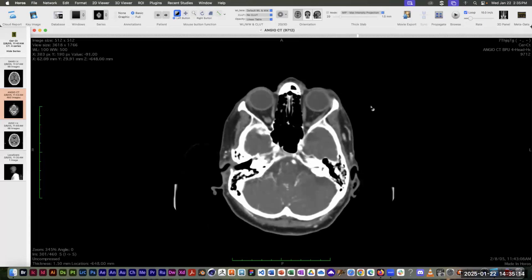All right. So anyway, you can scroll through and have fun looking at the individual slices. But the really interesting part of Horos is the ability to take those individual slices and stack them up to create a 3D model. There are two basic kinds of 3D models that we can create in here, and your exercise today is going to have you create one of each. We're going to create what's called a surface model, and then a volume model. I explained this briefly last time, but I wouldn't expect you to remember the difference.